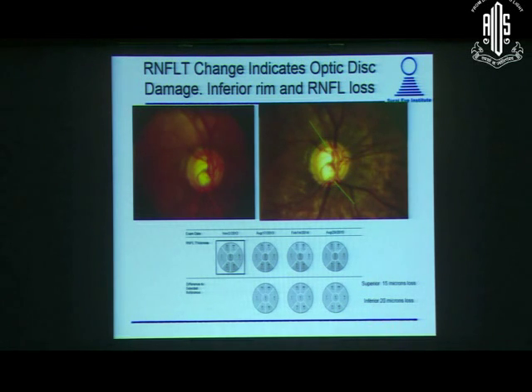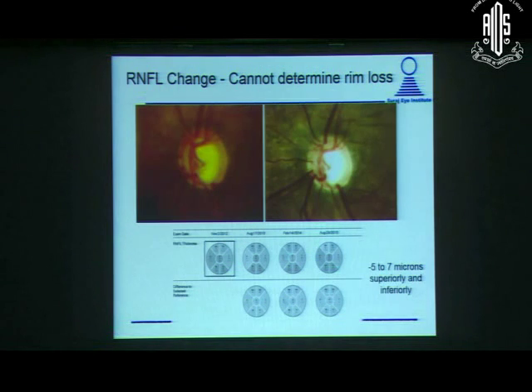Now sometimes these changes on the optic disc are very hard to evaluate because you just have unidimensional optic disc images, and most of us don't have access to or are not spending enough time taking stereo photographs. And I think that sometimes if you have a follow-up of the retinal nerve fiber layer, that can help you go back to the optic disc and take a look and see whether optic disc damage correlates with the retinal nerve fiber layer loss that the OCT shows.